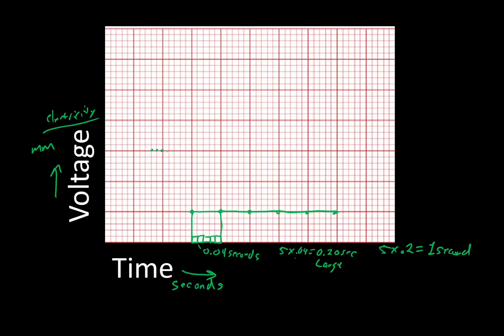nothing going on. And what the paper does and what EKGs do is measure how much electricity total at that very instant in time is flowing in any one direction, whether it's flowing towards the electrode, making it positive, or if the electricity is flowing the opposite direction, which makes it negative. But it just adds up how much electricity it sees, plain and simple. So if we're going along and then it measures a total positive electricity at that moment coming towards it, and then less electricity the second later, you wind up getting this little arch. And then if it measures nothing, you see nothing.